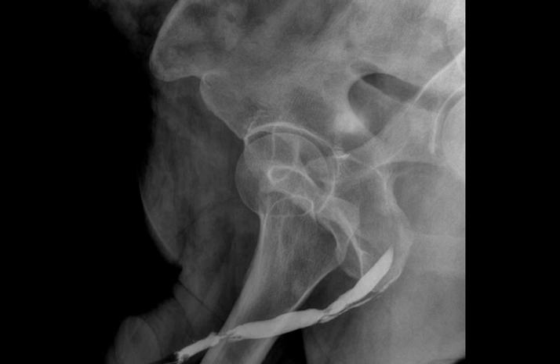In case of infection, you look for a urethritis. These are for multifocal areas of strictures and stenosis and things like that. Yes, iodine containing contrast.